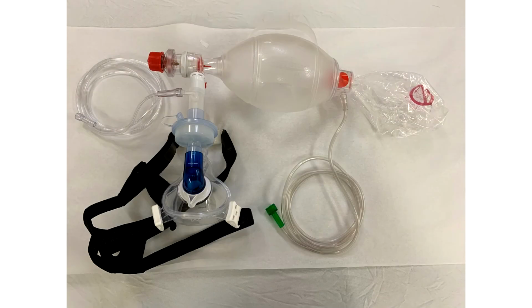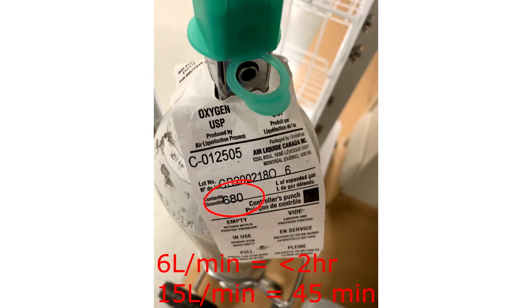And finally, you'll need to speak to your referral center regarding whether or not they'll accept a patient with this setup. Many will consider this an aerosolizing setup. In addition, the setup requires two sources of oxygen, which may pose a logistical issue for transport. If you need to use an O2 tank as your second source of oxygen in your department, it's a good idea to take note of how much oxygen your tanks actually hold. This will give you an idea of how long you have using this setup.